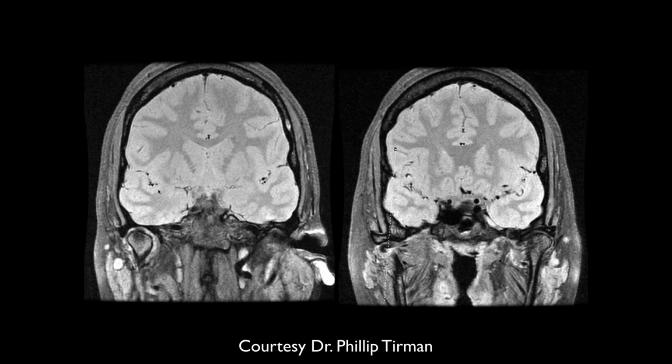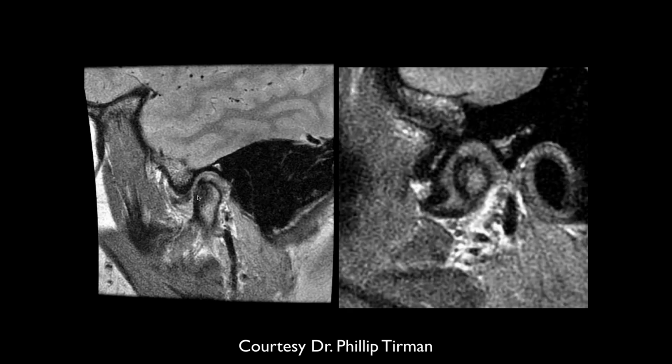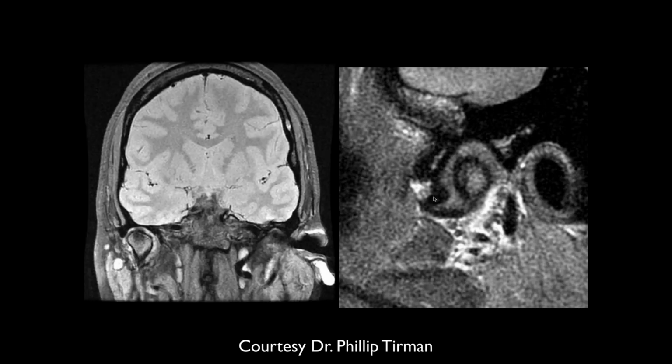Okay, so maybe the disc on the left, or on the right, it looks laterally extruded. So, you know, this one is centrally, the normal position. This is medially displaced. Right. And this one certainly laterally is abnormal. Anteriorly displaced. Laterally. So here we can see it's anteriorly displaced. Right. And here it's anteriorly displaced, but we're getting more lateral, so it actually looks like it's bigger laterally.